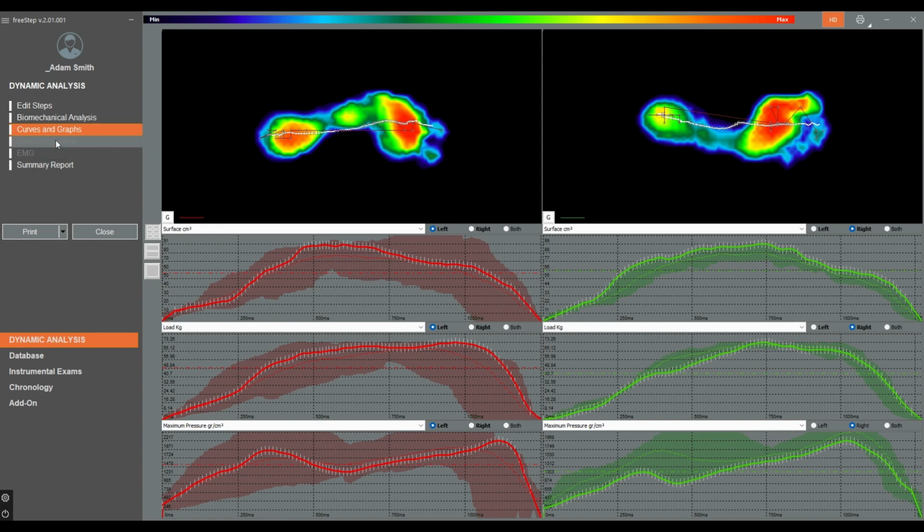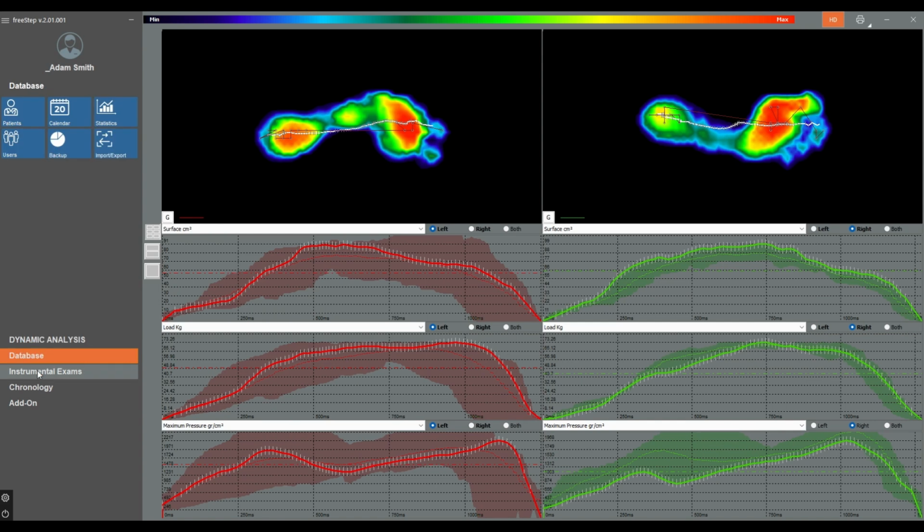And there's no video with this patient. I'm happy to do more. I'm happy for you to even send patients over. You could send us a file where you export their data, and there's the import export button here, and you can always send that to me. I can have a look at it and either send you an email or a quick WhatsApp or even a video, if that helps you understand what's going on and sort of cold read a case and see whether that can help you. I'm more than happy to do that.